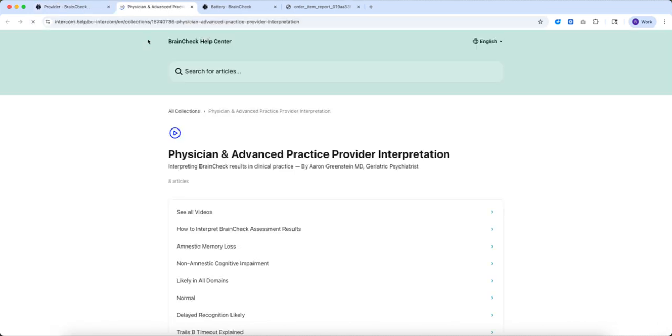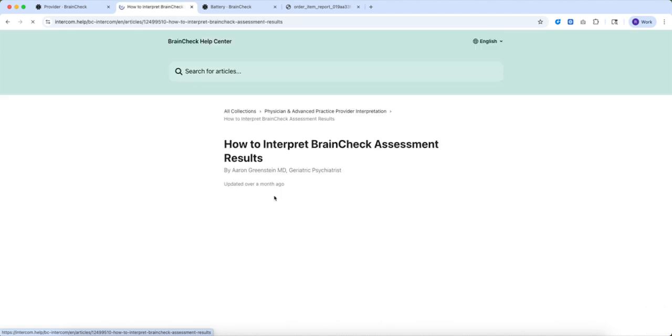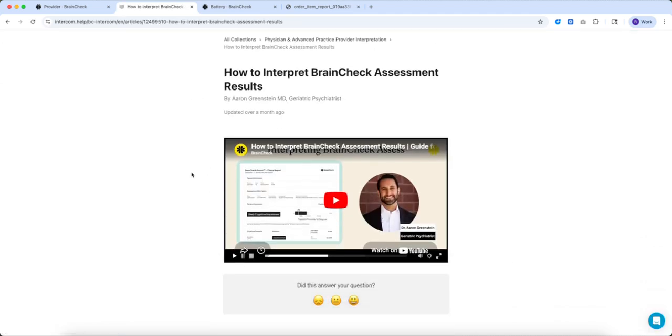Up here in the interpretation videos, this is actually something that tends to surprise our new users. Most clinicians, primary care, neurology, psych, or geriatrics, didn't necessarily train specifically in cognitive assessment interpretation. So we actually had a geriatric psychiatrist record a library of short videos walking you through exactly what each result pattern means and what to do next. It's built in, it's free, and it's the difference between getting a score and actually knowing what to do with it. And your whole team has access.